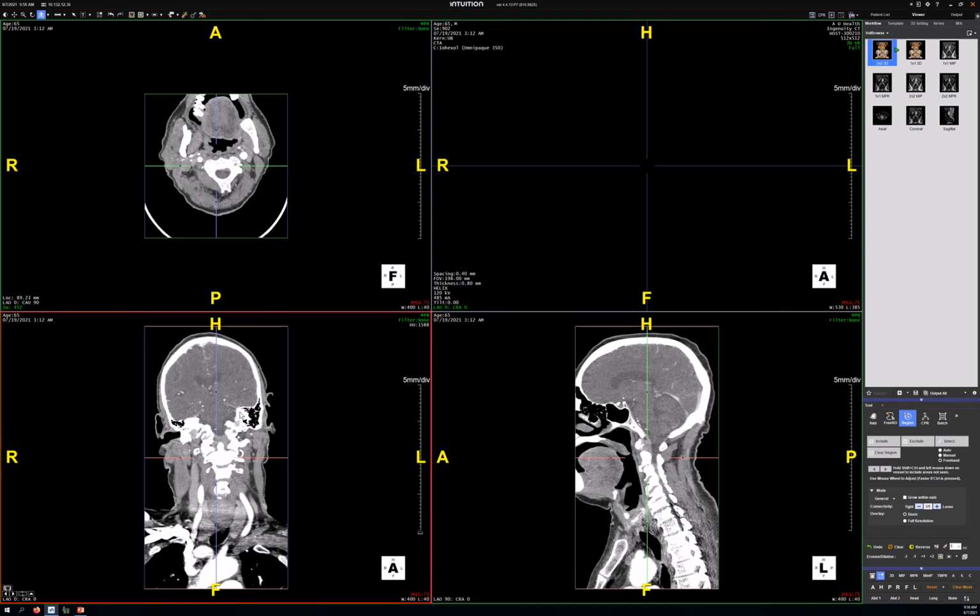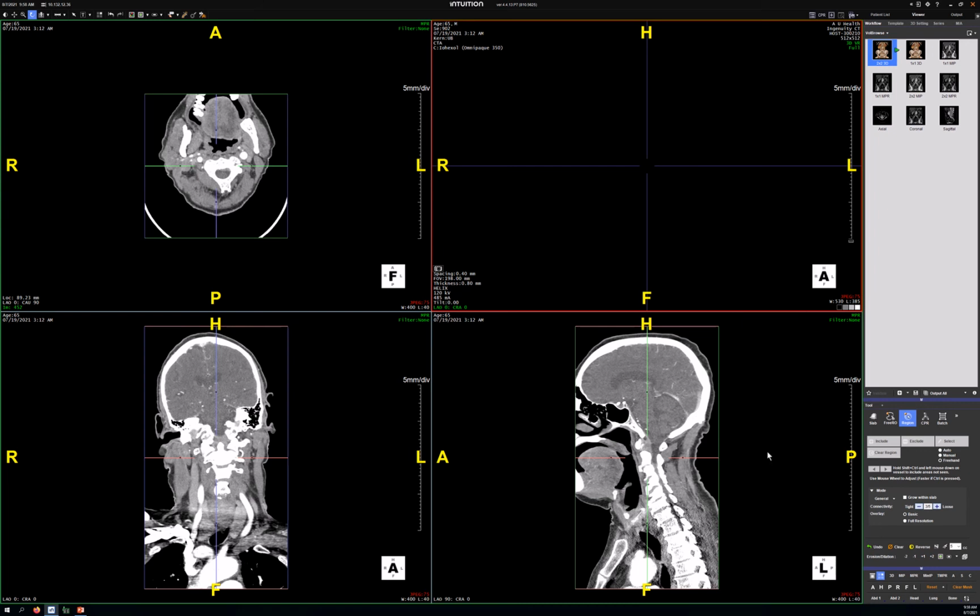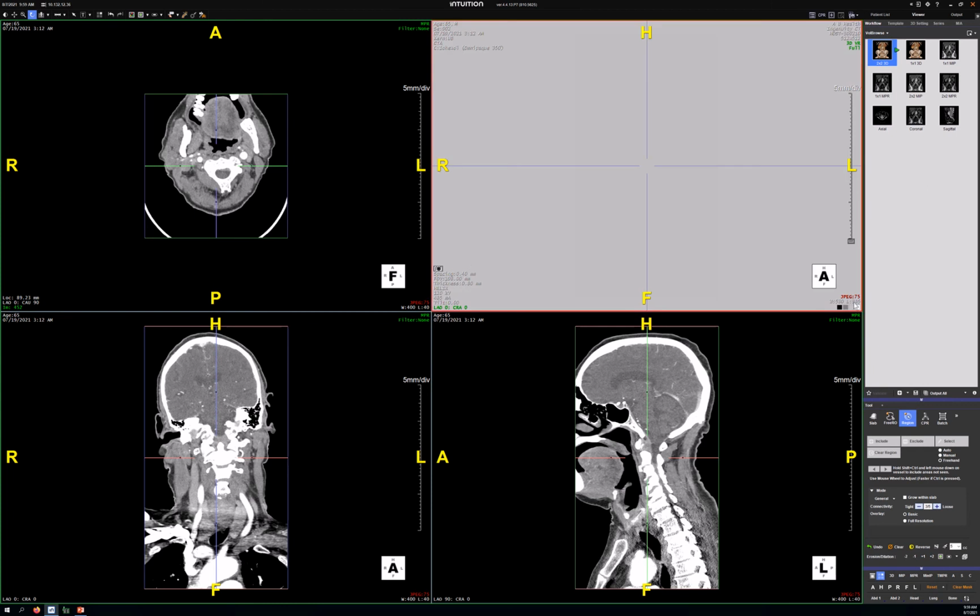So one thing I do when I'm working in object space is make the background gray. There are 2 different ways to do that. There are the 4 little cubes there, or you can right-click and get a contextual menu and go down to the bottom where it says background color and do any color you want. So if you wanted a lemon or a cream or a blue, you could do it from there.